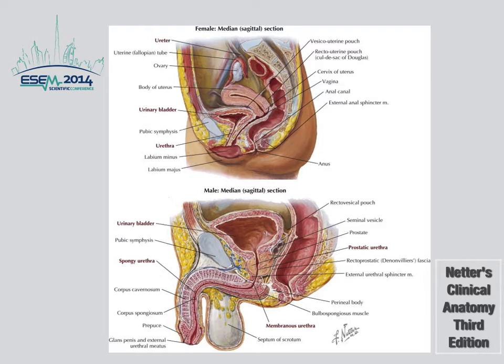Similarly, fluid in the splenorenal recess on the left side may overflow and travel down the left paracolic gutter into the pelvis or over to Morrison's pouch on the right side. So the important spaces that you're going to interrogate is the rectovesicular space in males and the rectouterine space or pouch of Douglas in females.